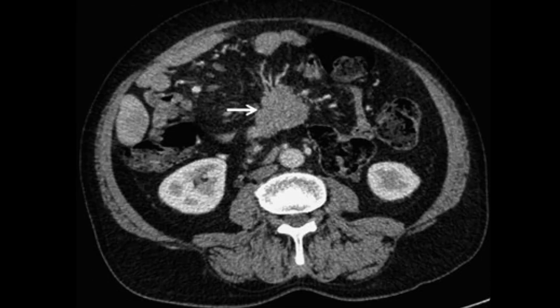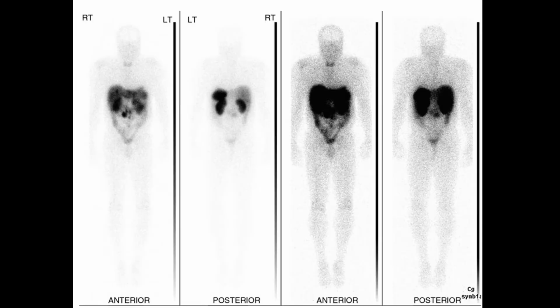In this slide we can again see a soft tissue density lesion present in the mesentery. Also we can see some amount of tethering of the adjacent bowel loops. So again my diagnosis in mind is carcinoid tumor, and I have asked for images showing the liver, but I am provided with this nuclear scan. So this is nothing but an indium 111 pentetreotide scan.